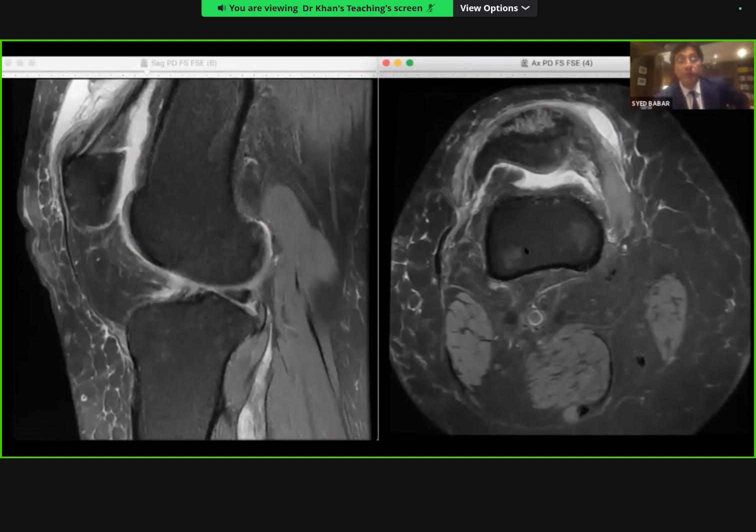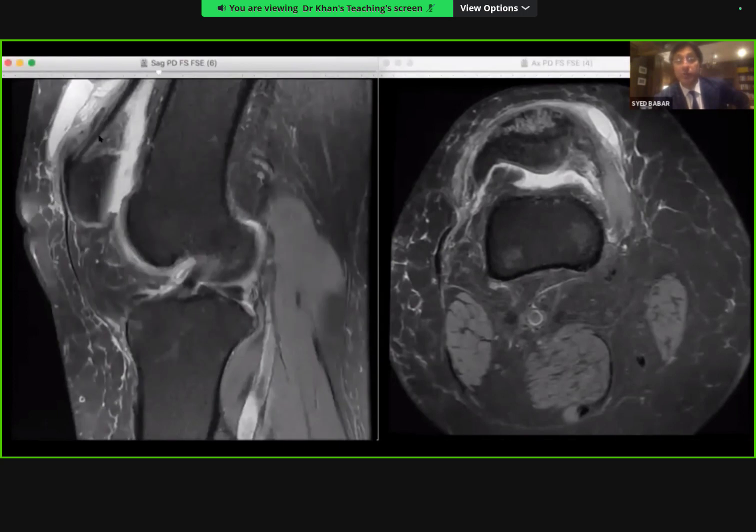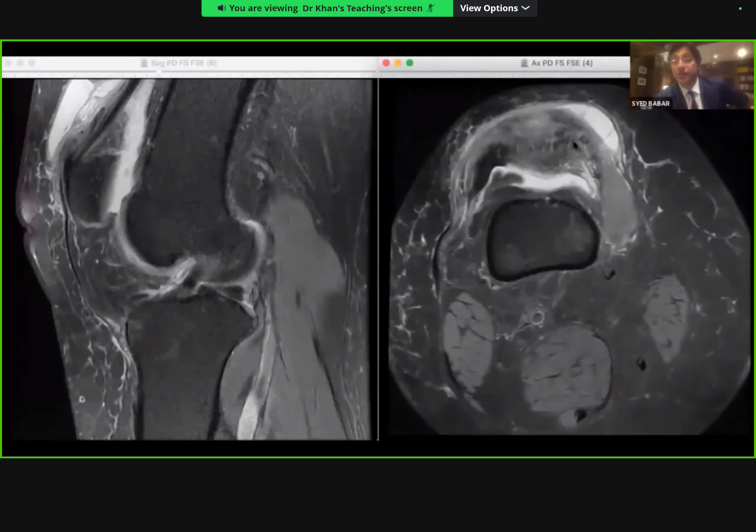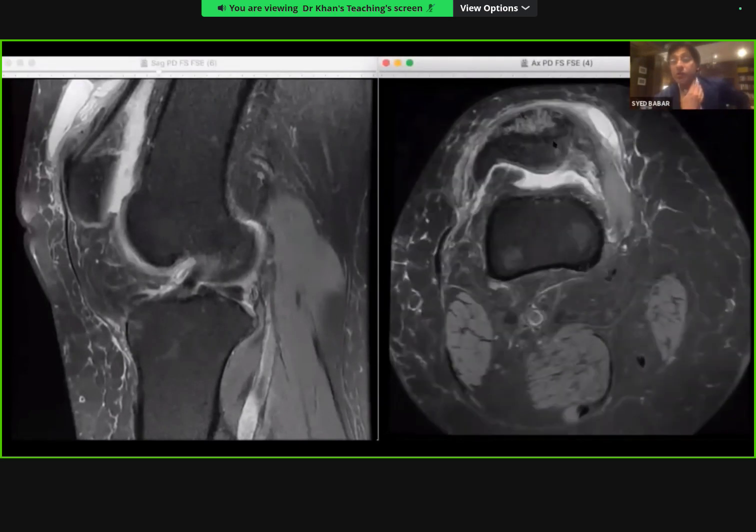Ultrasound is really important for tendons, especially the extensor mechanism, because ultrasound is superb in picking up patella and quadriceps tendons disruption. If you were to do an ultrasound, you'd easily tell us if there is any fiber which is intact or not. Now, if there is a central fiber which is still intact, you may have actually disrupted the tendon on either side, but the central tendon is still holding the quadriceps at the superior pole of the patella. So they may just treat them conservatively.